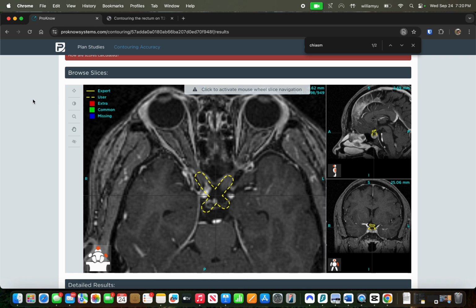In the first attempt, I had said I was looking for the lenses and I would be lining up the midplane of the optic chiasm with the lenses in the superior inferior direction. But that was a wrong misconception to hold on to because it's not true. The optic chiasm sits above the midplane of the lenses.